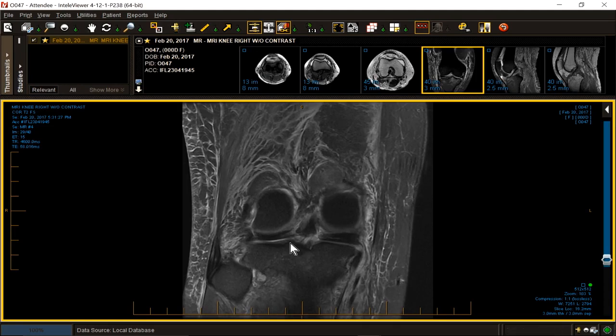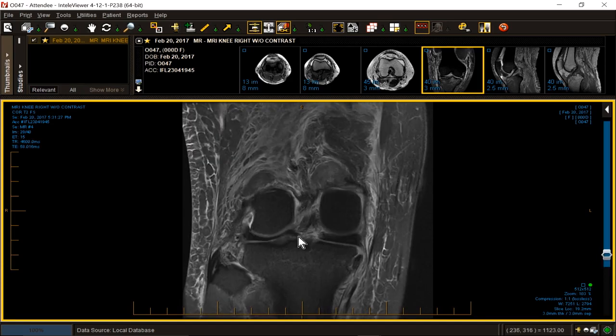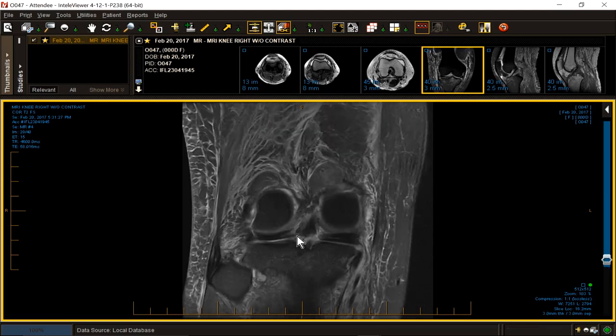And I've identified a meniscoligamentous tear right there. So the medial meniscus root ligament is torn. You could tear the ligament, or you could tear the root next to the ligament, or you could tear the posterior horn. This time we have torn, there's the ligament, there's the meniscus, they're not connected. On the other side, there's the ligament, there's the meniscus. They are connected. Okay, that's a subtle little finding, but by itself it could be relevant.